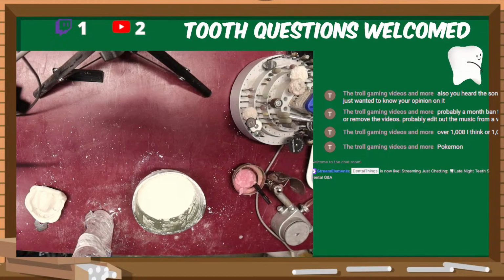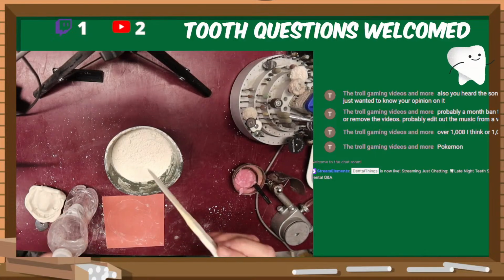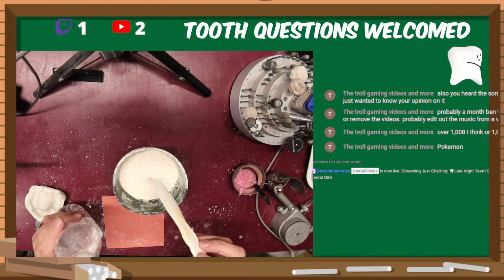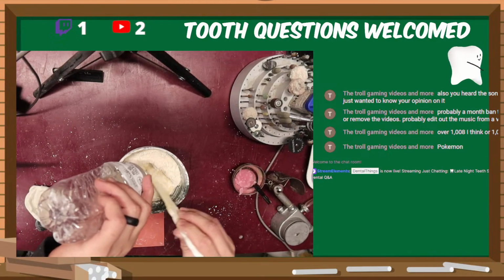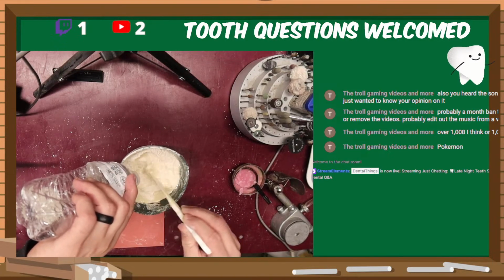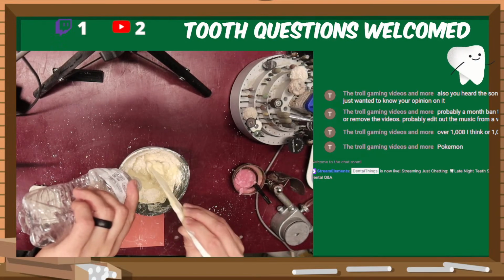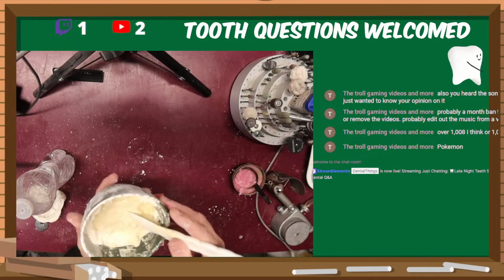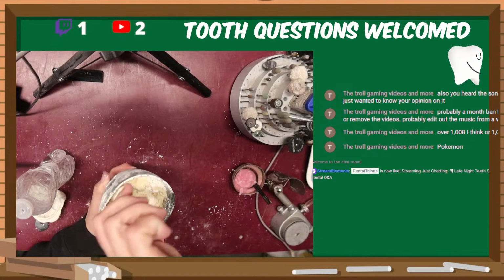Square. There you are. I don't think I need this much. I really don't need this much. So get it slightly wet.